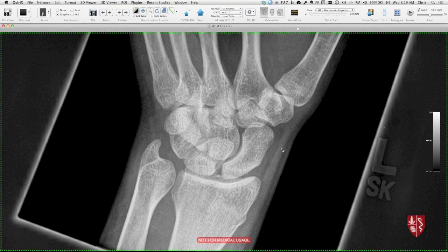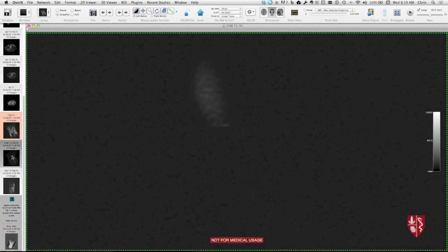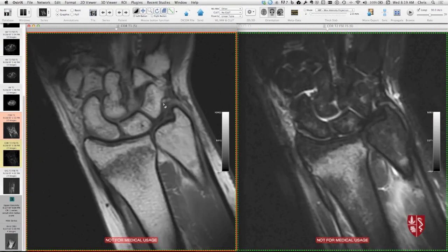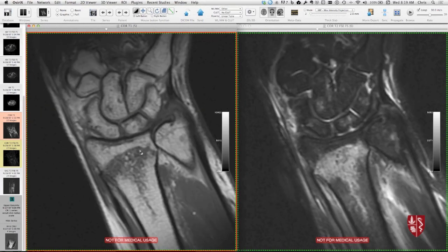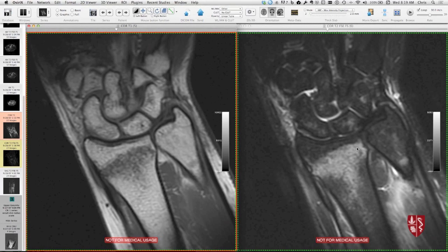suspicion of a fracture and you don't see it, it could be that MRI is helpful to diagnose an occult fracture. And so I wanted to show this example as well, because an MRI that was done a few days after that radiograph shows a nice example of an extra-articular distal radius fracture. So T1 low signal band across the distal radius, does not look like it goes to the articular surface. And on T2, lots of edema, okay?